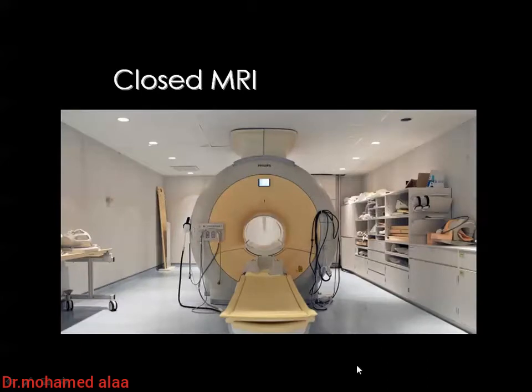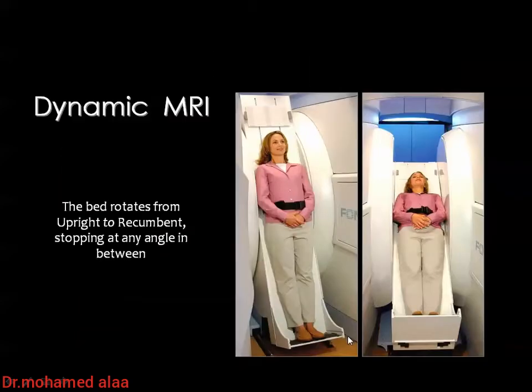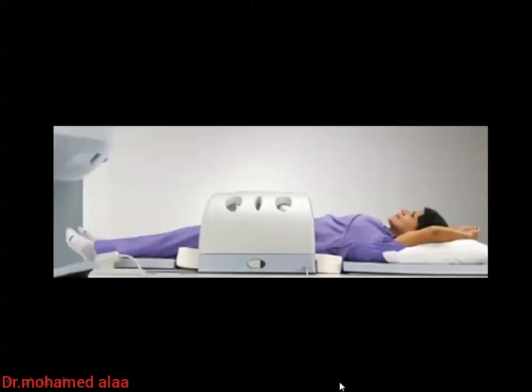MRI, you know that we have four machines: the closed magnet, the open MRI, the extremity MRI, and the dynamic MRI, where you can examine the patient in the weight-bearing situation while she is standing. Then we use MRI superficial or surface coils, and this is one of the coils that we use for imaging of the female pelvis.